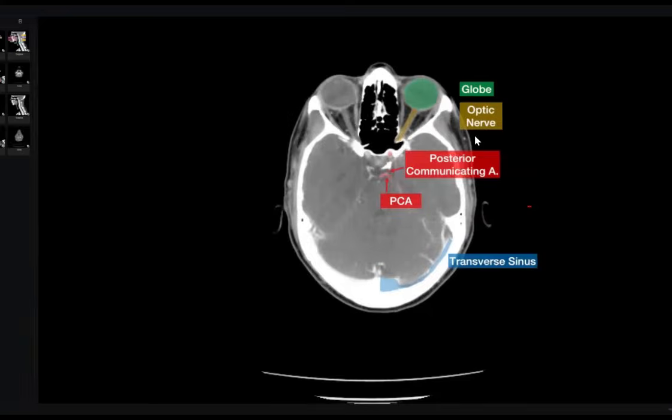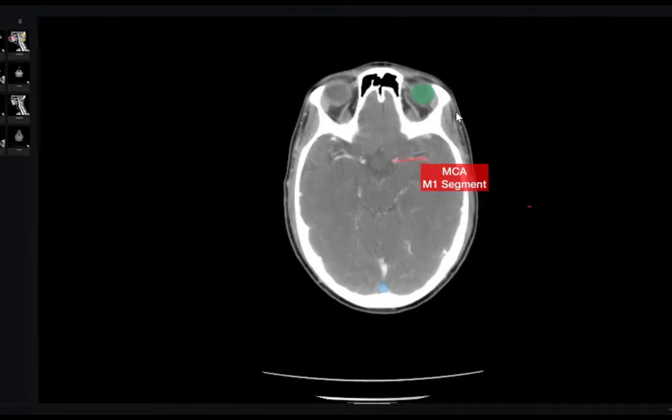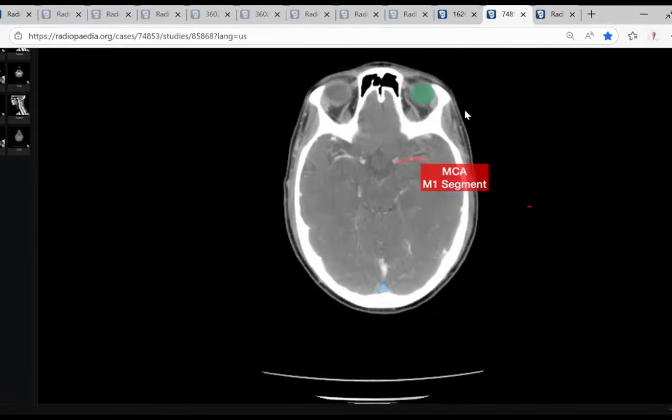Somebody will ask, Doctor, this is the arterial? No, look here. This is not pure arterial. Look here, this is the venous sinuses. So this is late arterial, early venous. So this is normally to be seen here. This is superior ophthalmic vein. Okay, my colleague, is this clear for all of you? Any question? Anyone has any doubt about this case?